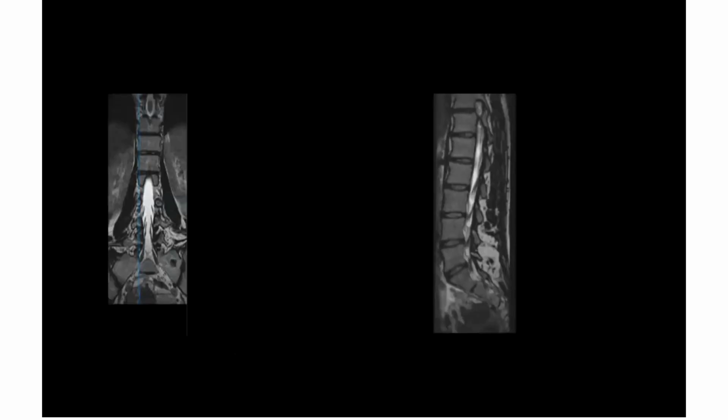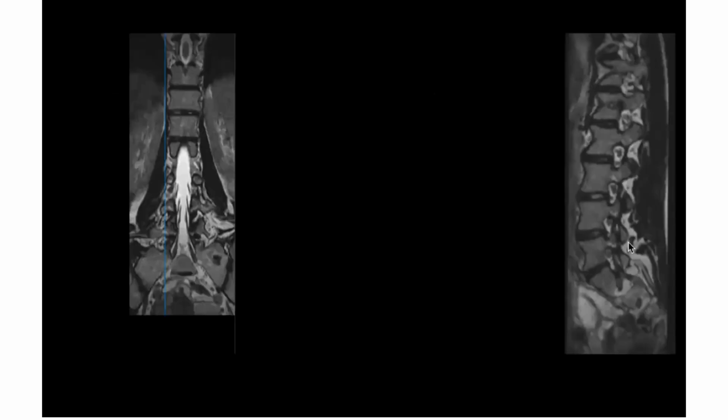Now, as you go more medial, we are approaching the lateral recess. Now we can see the traversing roots. Now you know the meaning of the exiting root and traversing root. I think we discussed it in the anatomy section. Why do we call it the traversing root? Because it is traversing the disc. So exiting root and traversing roots are in relation to the disc. In the foramen, this is the exiting root.